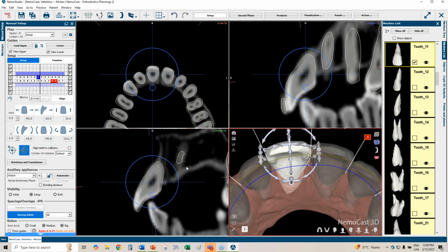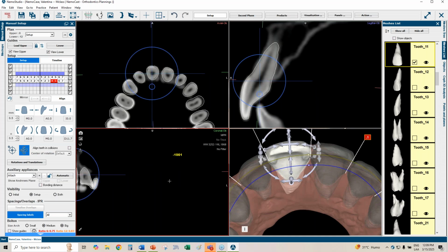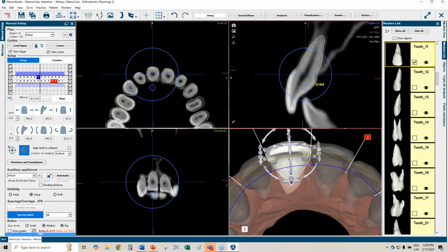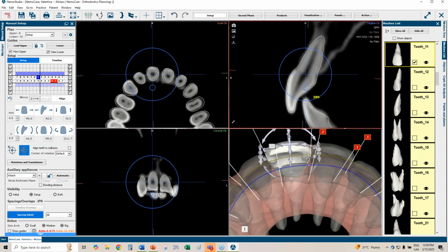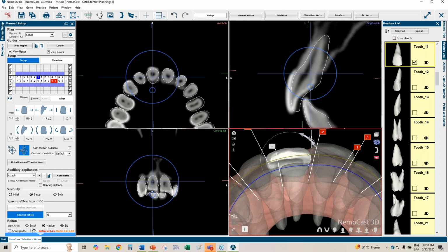And if we go to the 3D slices, I'm already seeing how much bone I have available for my central incisors. So for example, this one, let me activate the lower ones so we can visualize. If I want to achieve good overjet and good overbite, like so, I'm going to need to retract it.